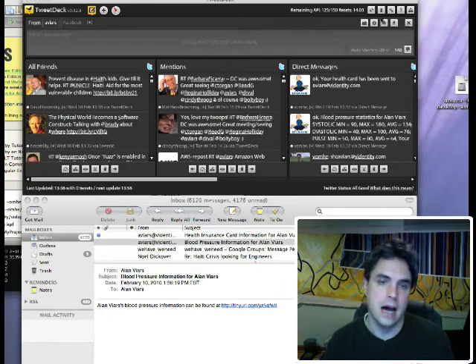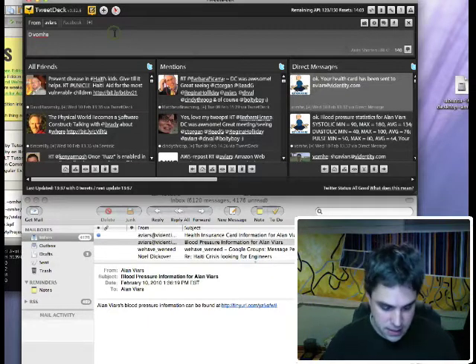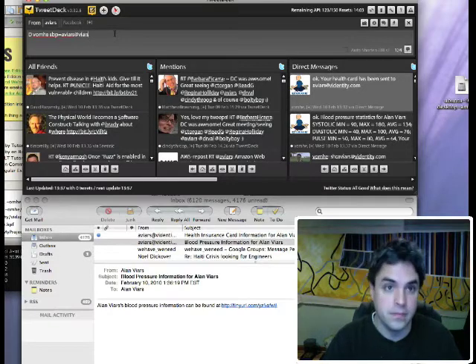And for these other examples, I will just use TweetDeck because it's easier and you can see it easier on your screen. So I can say send blood pressure, say to your physician, but in this case I'm going to send it to myself.